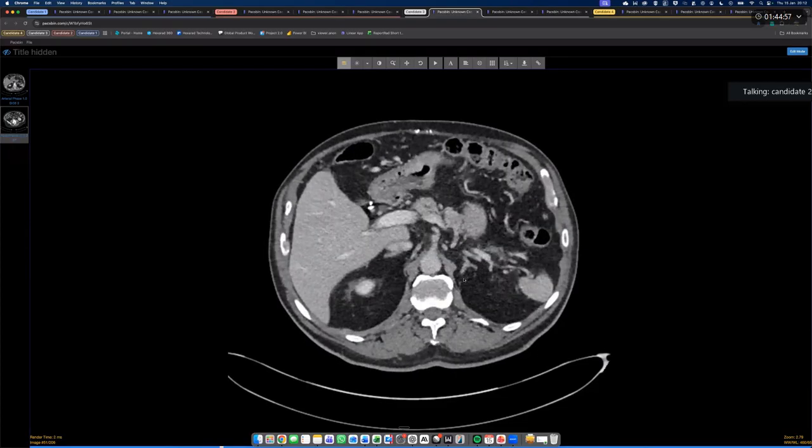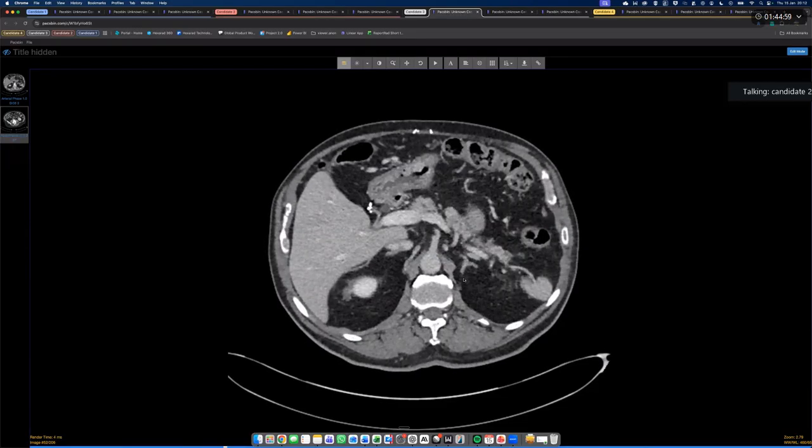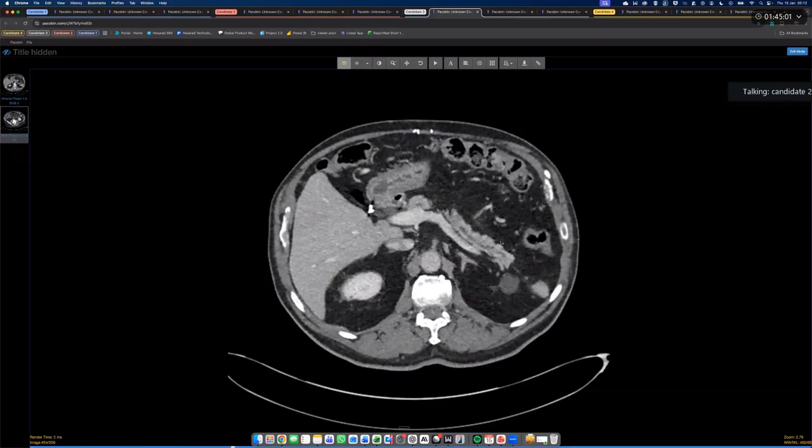Since the patient has come with recent onset of diabetes, I would like to check for this pancreatic lesion. I would be concerned for pancreatic neuroendocrine tumor, which I would be looking at the arterial phase to look for enhancement since it's hypervascular, but there isn't any related liver parenchymal lesion. I would also like to check for any relevant tumor markers in this patient.